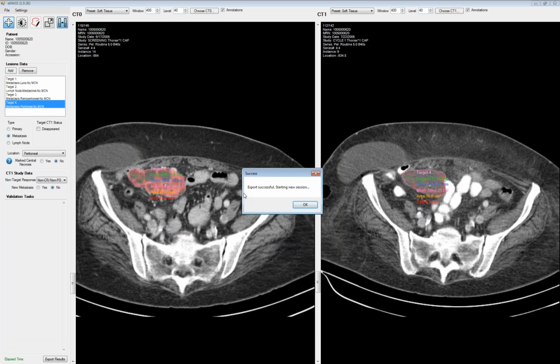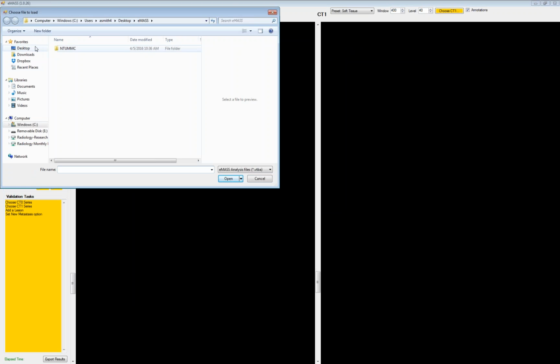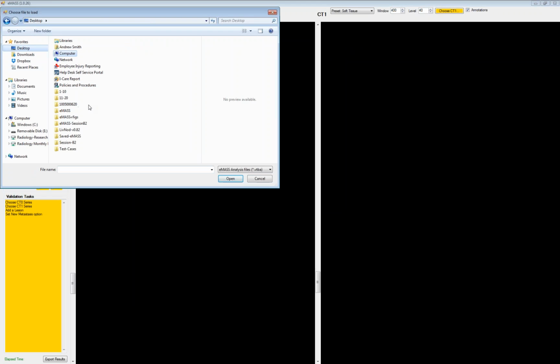I'm going to go ahead and click out of this, and it's already asking me, hey, are you ready to do the next case? Yes, I am, but what if we had an error or a query in that? Well, we could come back and reload that case. It's not impossible to do that. If I can find here, one moment here.